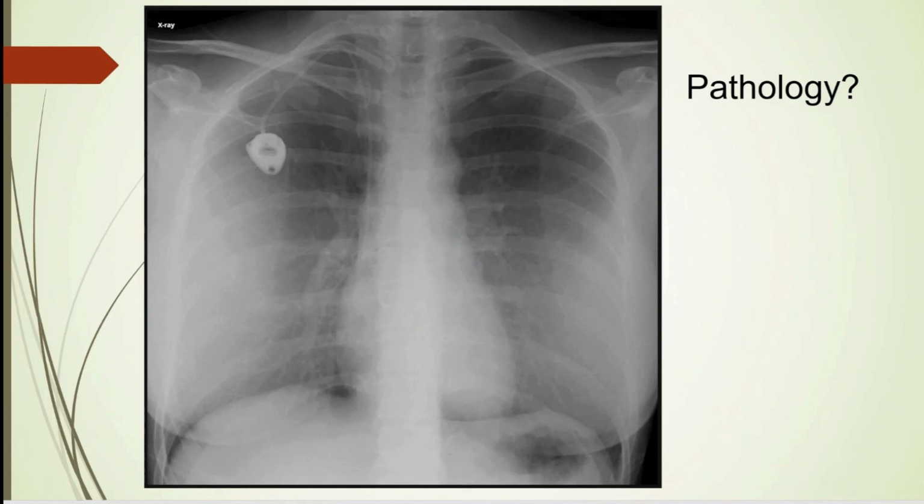All right, so here is a chest x-ray. And let's start at the beginning. A for airway. Here's the trachea coming down. A little difficult to see, but I believe this is probably the carina. If we count down, here is the first rib and second rib. So it would be T2, T3. A little hard to see. So let's see, back to here. Here's the first rib, so that's T1 here. T2, looks like T3.